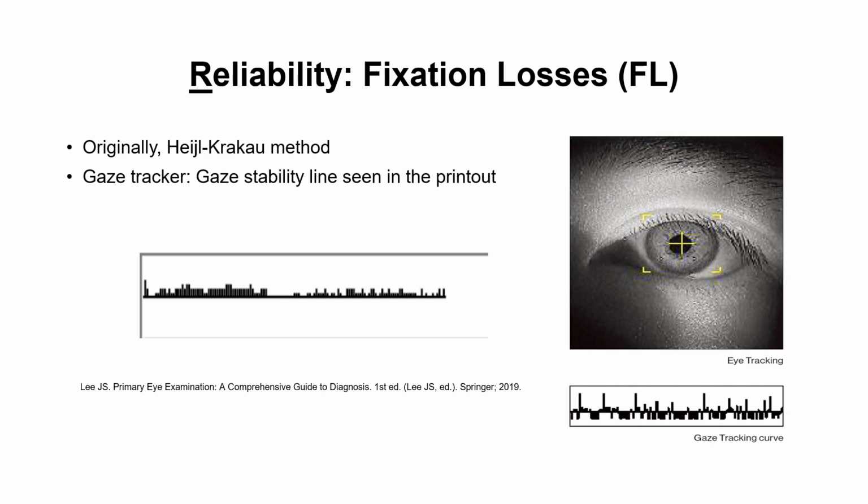Here in these points, it means that the gaze was stable. However, when you see it up, it means that the eye moved. So upstrokes means that there was increased eye movement, and if you see downstrokes, it means that there was lid movement.